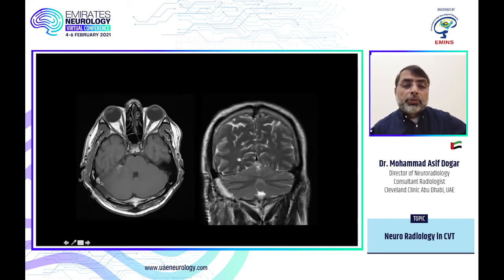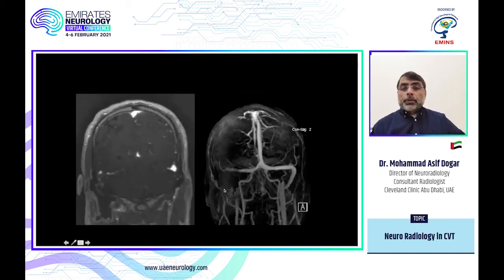And here you can see on the T1, this is a clot here. On the T2, you can see clot here. Okay, so again, you can see there's a non-filling of this transverse sinus.